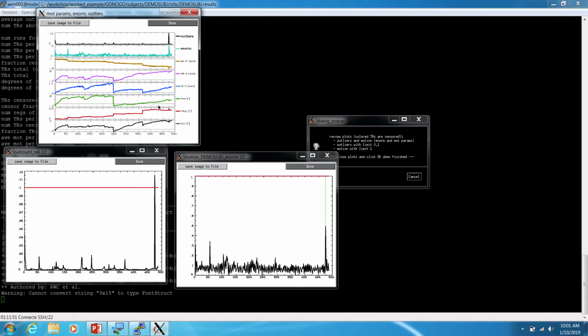And these are incorporated into our analysis as regressors to reduce the chance that we're talking about a different voxel than the one we think we're talking about. So what you might expect to see is right around this spike here, there should be some shift in these planes. And that just sort of verifies that, oh, it makes sense there's changes here.